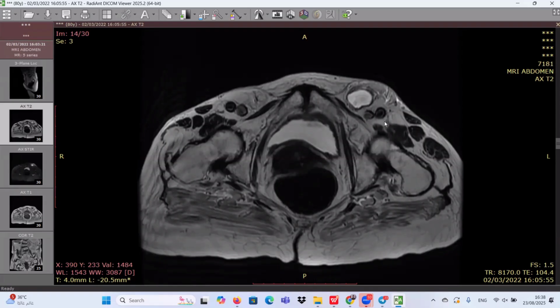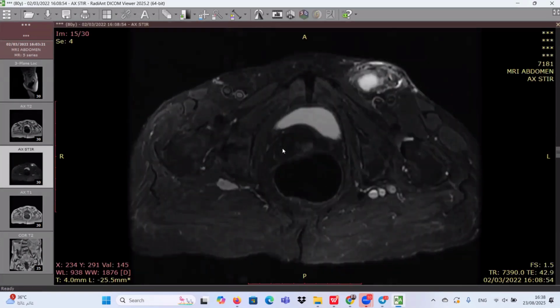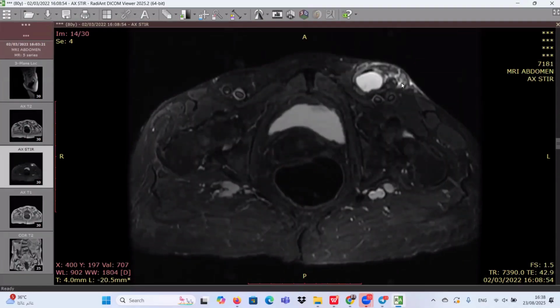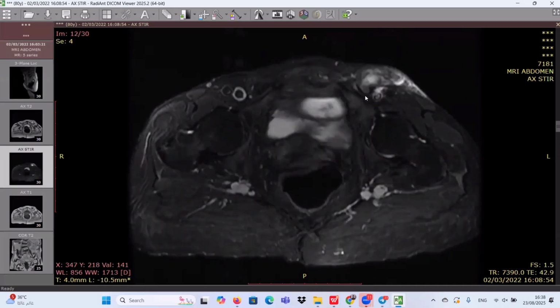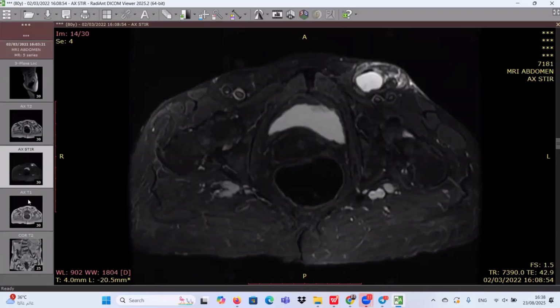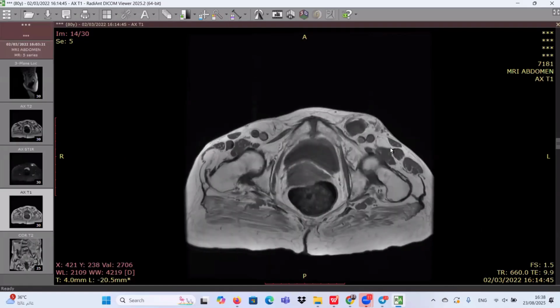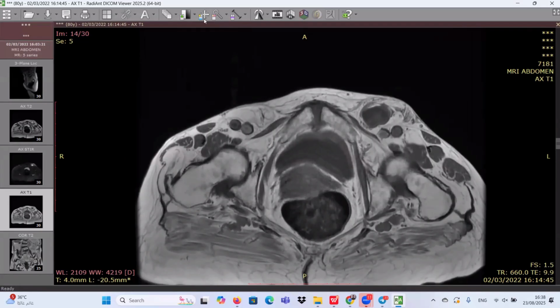It's a clinical term, but we have some findings radiologically that can suggest an incarcerated hernia. If you want to say incarcerated hernia, you should see surrounding soft tissue edema, dilated bowel loops, a narrow neck at this point, and also sometimes slight mural wall thickening. Okay.